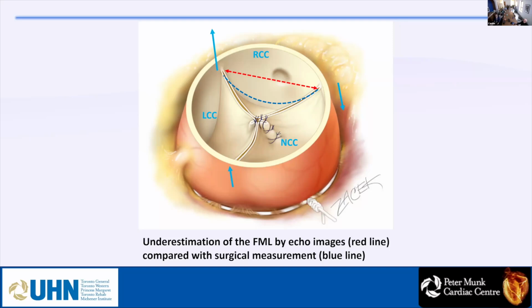You might ask me, what is the role of measuring the free margin lengths? It's very important because the three leaflets don't have the same size free margin lengths.